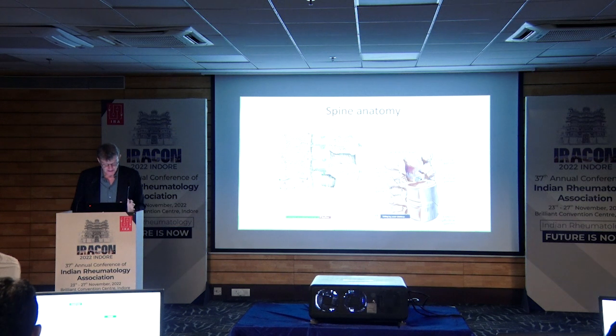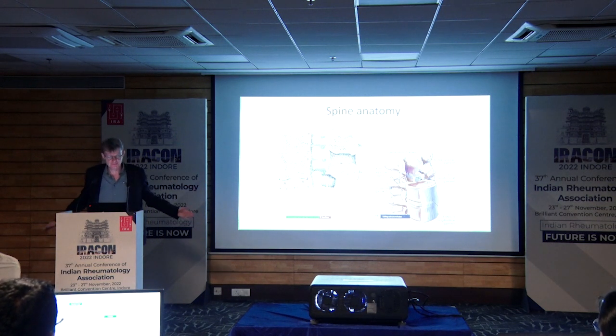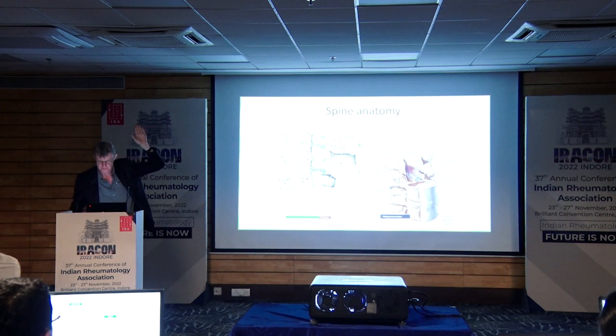Then you also have the pedicle, which goes out. There is a pedicle going backwards on the side of the spinal canal. Then it moves backwards and divides, forming a superior process going upwards, meeting the inferior process going downwards in a facet joint. That's what you see here.